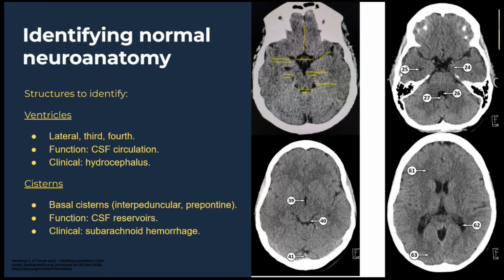It's good. And then the third ventricle should be visible on the bottom left image. So is it either 39, 40, or 41? Yeah, so 39.